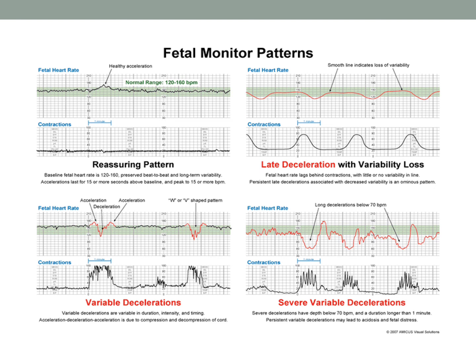And then these are some fetal monitoring patterns for you guys to view. Healthy acceleration. Remember, look at this. This is the category 3. You have no variability in recurrent late decelerations. And then over here, you have variable decelerations, which is a quick drop. And in this case, you have what we call shoulders. The deceleration is preceded and proceeded by an acceleration.